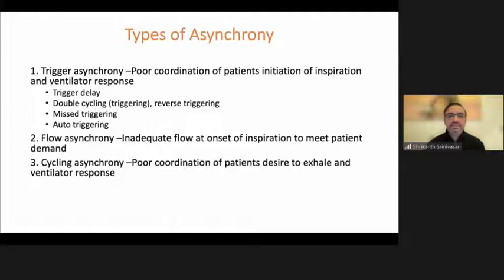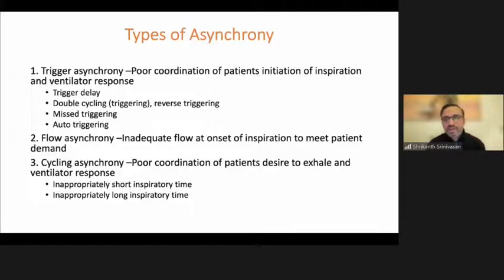Both these things can lead to what's called cycling asynchrony. It could be because of an inappropriately short inspiratory time: the patient required a much longer time before exhalation should start, but the time was very short. Or an inappropriately long inspiratory time, where the patient wishes to exhale, but the ventilator continues giving the flow for a longer period of time than what is required.